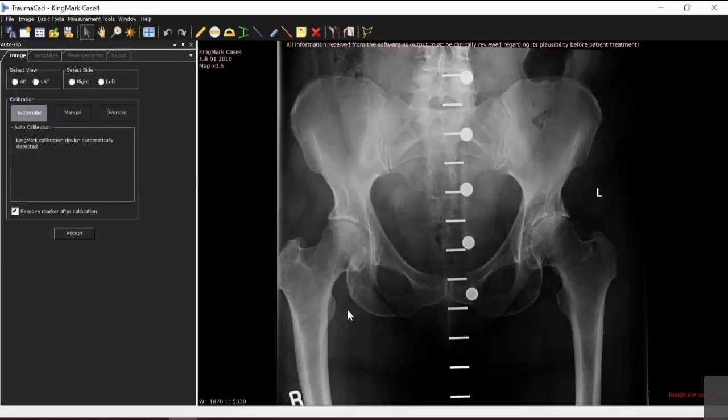So the X-ray tube is typically placed at a full film focal distance of 1.8 to 2 meters. The patient is standing with ideally the calibration ball placed midpoint from posterior to anterior at the level of the femoral condyle. Yes, it could be placed further down the leg, but with the diverging X-ray beam, it's better to have it at 90 degrees to the X-ray beam.